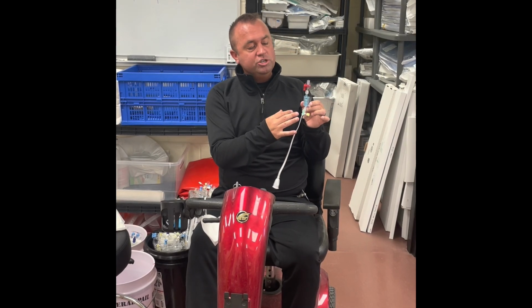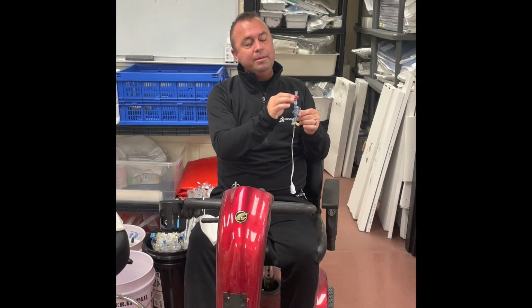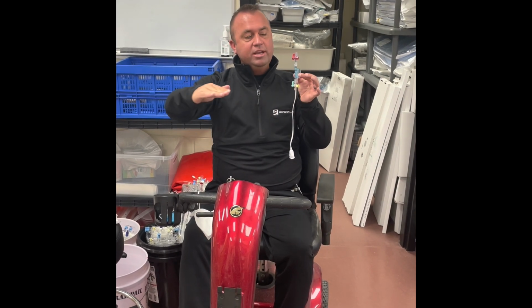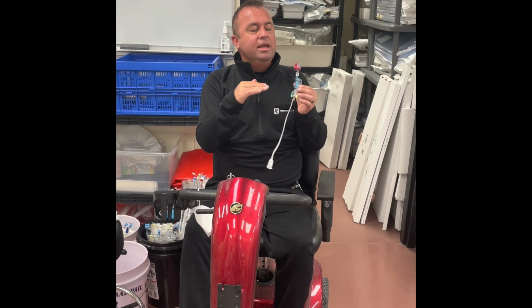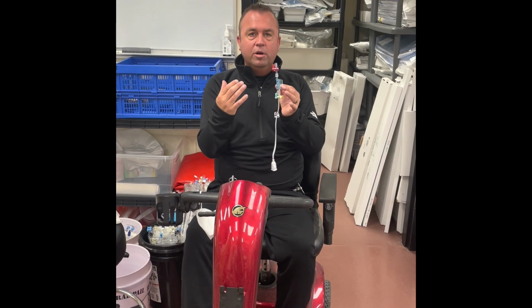To zero a pressure transducer, we would want to open the pressure transducer to atmosphere. So we would take it off the patient, open it to atmosphere, and zero it exactly even to where the left atrium of our patient is. Why the left atrium, or the heart essentially? That's where the major volume and the pressure is being generated from our patient.